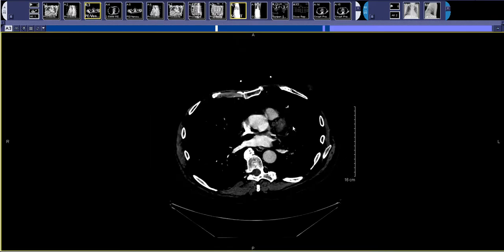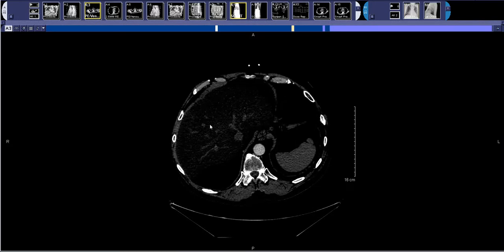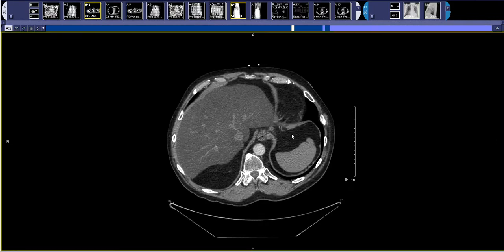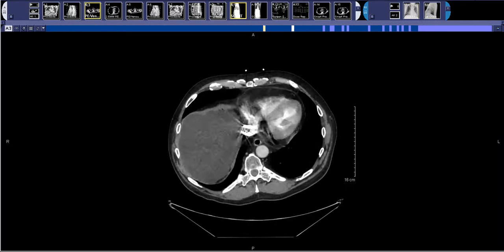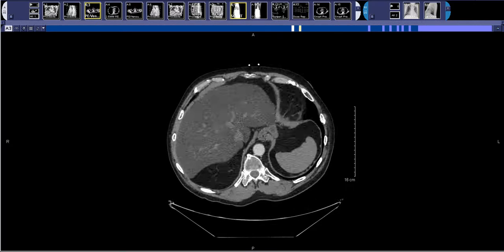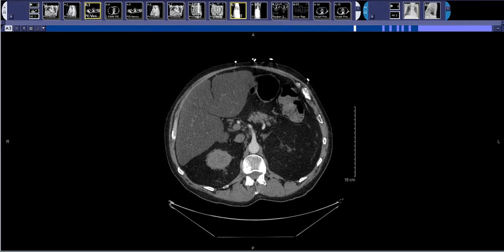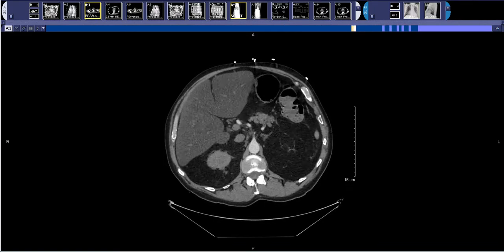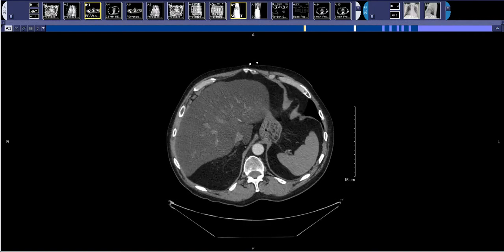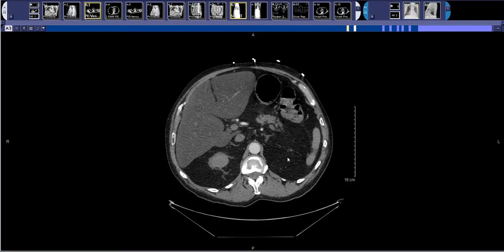After I've looked through the lungs, I switch to looking at the upper abdomen. I switch to my liver windows. This person has pretty severe hepatic steatosis, so you can see their liver is a lot darker than their spleen. So I quickly scroll through the liver, spleen. I always make sure I look at the pancreas, or what I can see of it on the chest CTs, since you hate to miss a pancreatic cancer. Then I look at the adrenal glands, especially if you think there's a lung cancer on a person, and then whatever top part of the kidneys you see.